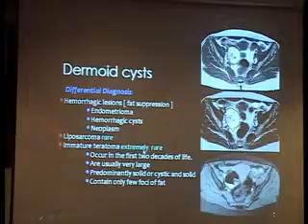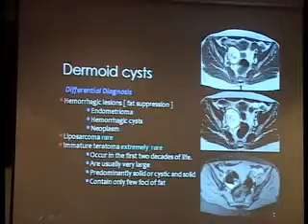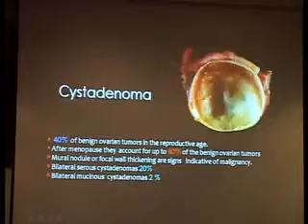And hemorrhage may occur in the hemorrhagic ovarian cyst or ovarian endometrioma, and both contain high signal in T1, but they will show different appearance in the T2 and in the fat suppressed images. Most of other lesions containing fat in the ovary are extremely rare, like liposarcoma and immature teratoma.